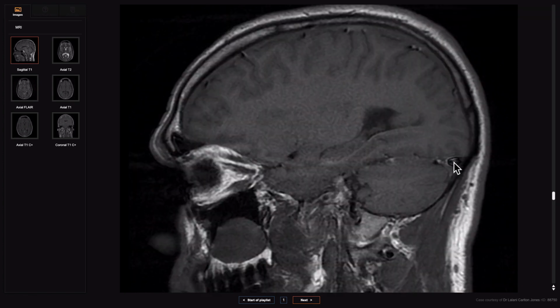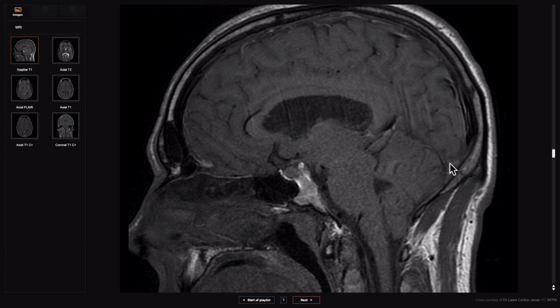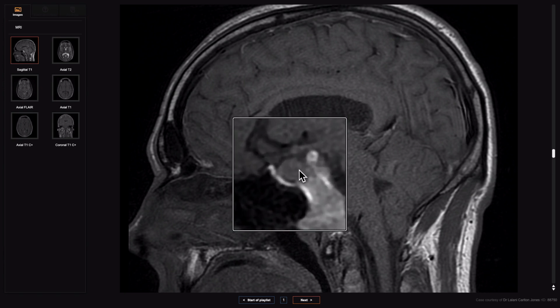But you can also see this compensatory blood volume expansion manifest as venous hyperemia. We can see that again on this midline sagittal T1 when we look at the pituitary gland. So you get a pituitary hyperemia as a result of that venous hyperemia. And here you can see the pituitary gland looks enlarged with a superior convexity to its superior surface.